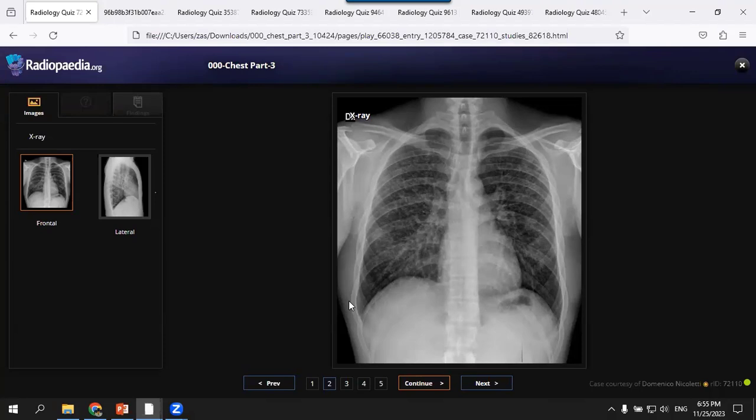Apart from that, if it is an immunodeficient patient, I would also have thought about lymphocytic interstitial pneumonia, but I'm not keeping it in my top differential.